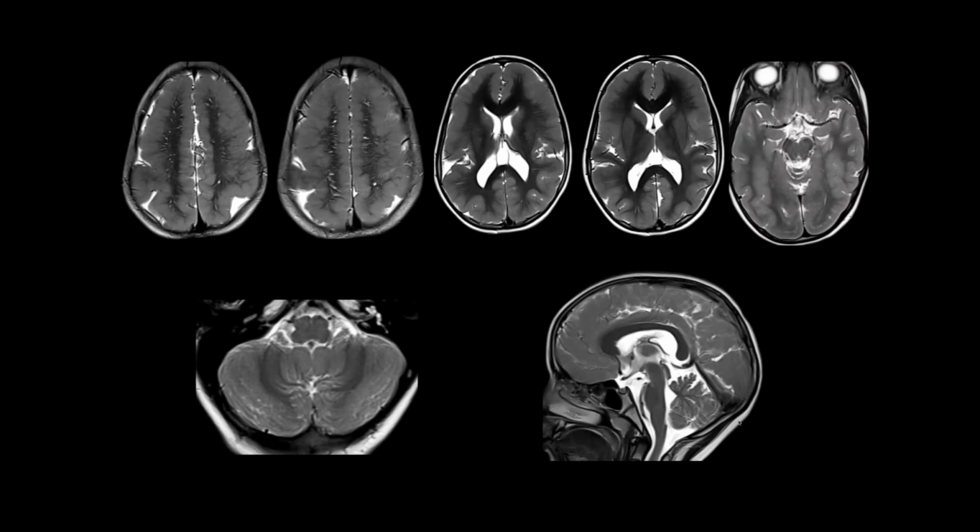So here we have the MR images, the T2 axial images on top, and I can appreciate that the bilateral frontoparietal regions are severely malformed. This is demonstrating a cobblestone type malformation. Almost the entire cerebral hemisphere cortex is abnormal. There's a slight abnormality of the ventricles. The basal ganglia and thalami demonstrate normal appearance. There are some subcortical hyperintensities, these linear hyperintensities adjacent to the cortical malformation.